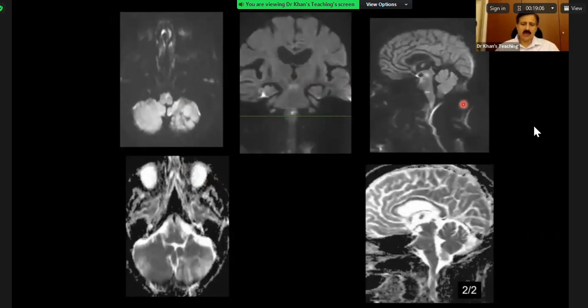And on recall, this patient, we recalled within the next 2 hours actually. And you can see here was the doubtful finding, but now you are more confident. And here on a sagittal, look at this T2, ADC. So what I wanted to show you is 3-plane DWI, and some centers are using it as a standard thing.